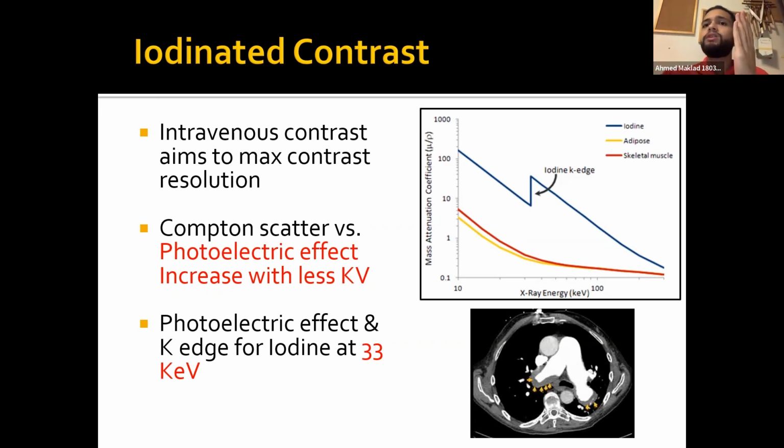And you can see here, this is the pulmonary trunk or the pulmonary artery. If there's anything inside that pulmonary artery that is distorting it, like an embolus or something, you're going to be easily able to see it, because the difference between this sparkling white and that tiny small speck of black is going to be way more obvious when you put contrast.